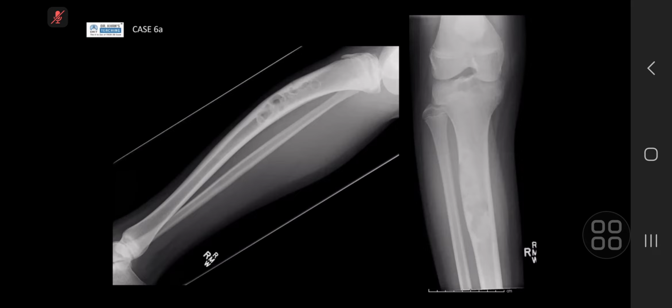If the patient has a fever, I would put infective etiology as my first differential. Did you say infection? Brodie's abscess. Okay. Is this a typical location for infection? No, it is not. And where would you tend to see infection or Brodie's abscess? It would be more distal tibial metaphyseal, or proximally.